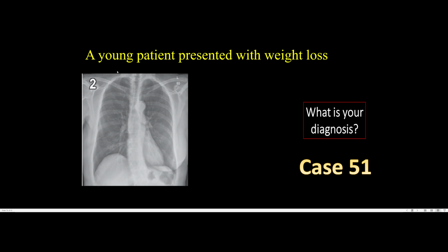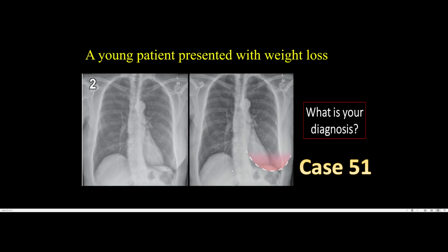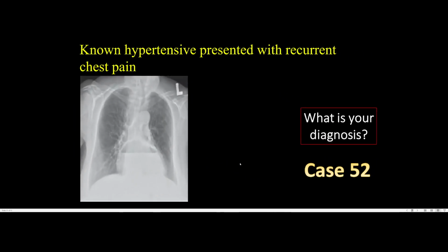Because remember, this patient is young, presented with weight loss. She had her right breast removed. So you want to look for lung cancer, or lung metastasis from a previous breast cancer, like ductal carcinoma, for example. So there's no specific diagnosis. You just want to put your eyes on everything. You want to look for obvious stuff like mastectomy. This is pretty much it.